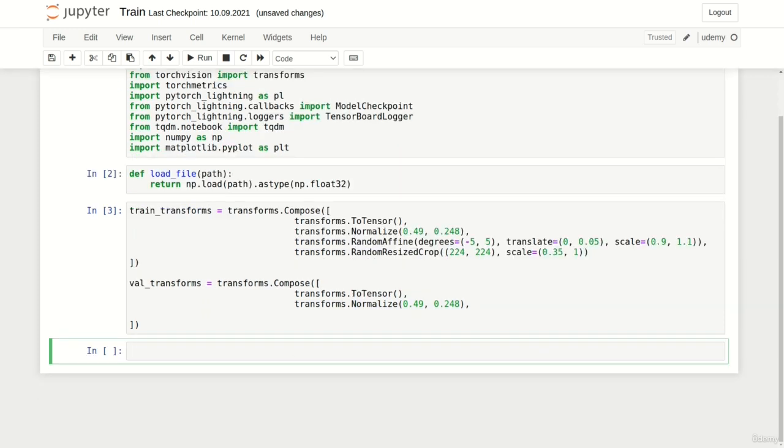Alright, we have successfully defined our transforms objects. Finally, we create the train and validation datasets. At first, we define train_dataset and now use torchvision.datasets.DatasetFolder, where we pass at first the root directory to our images. In my case, this is simply processed/train. Again, please verify that you use the path style according to your OS.